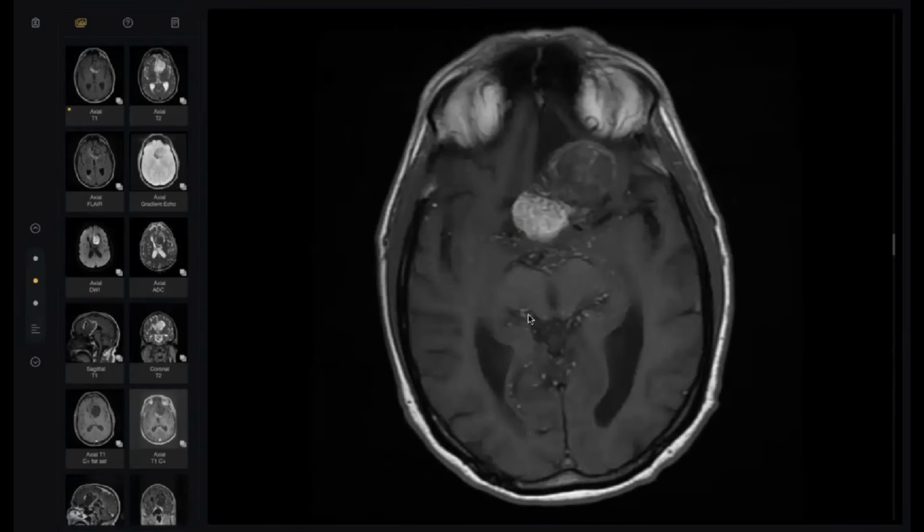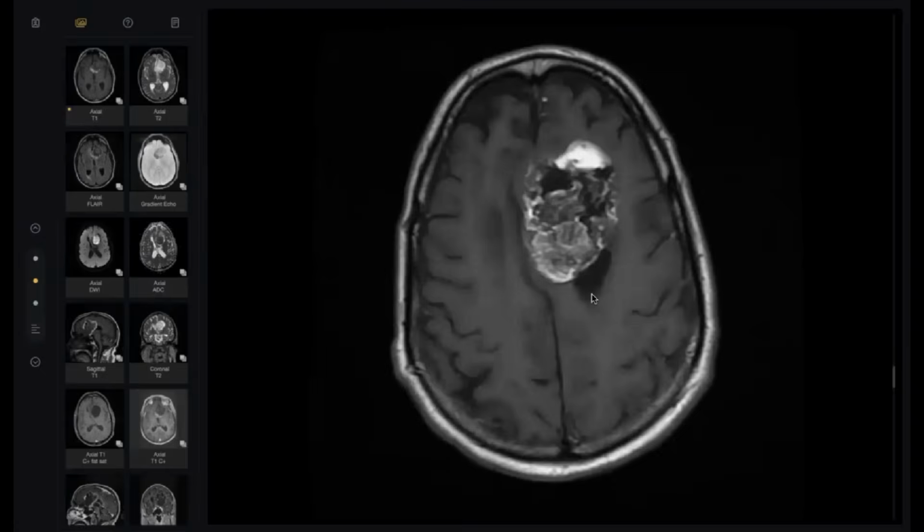Look here. Very characteristic. Suppose you are in doubt, this is a hemorrhagic lesion, something like this. When the hemorrhage spreads in the subarachnoid space, it doesn't spread like separate globules like this. This is very, very characteristic of the fat.